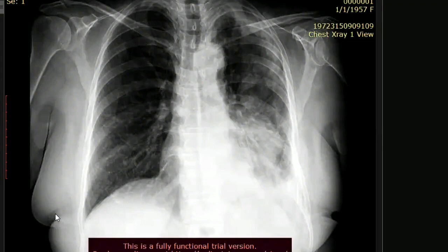Hello. What do you want to see on the lateral view? I have a CT scan of this patient, and what are your differentials on this X-ray? Ma'am, there is significant pleural thickening as well. But this is a female patient. It can be a pleural disease as well.